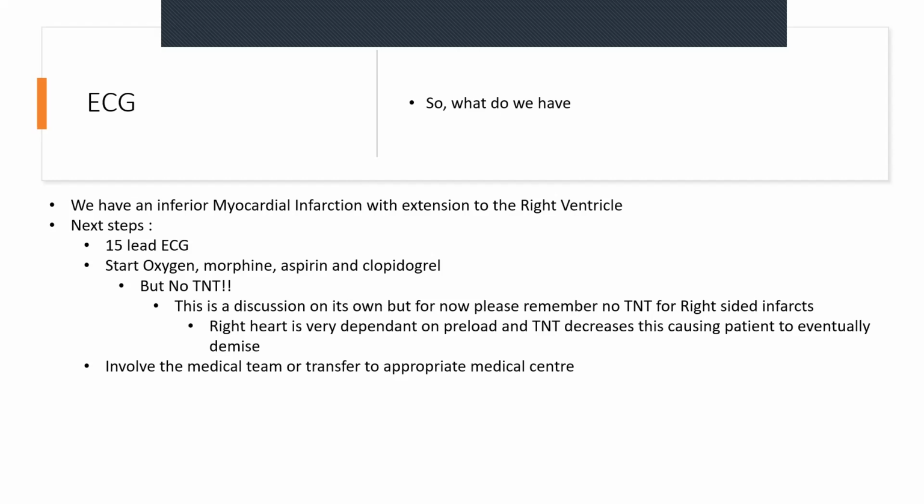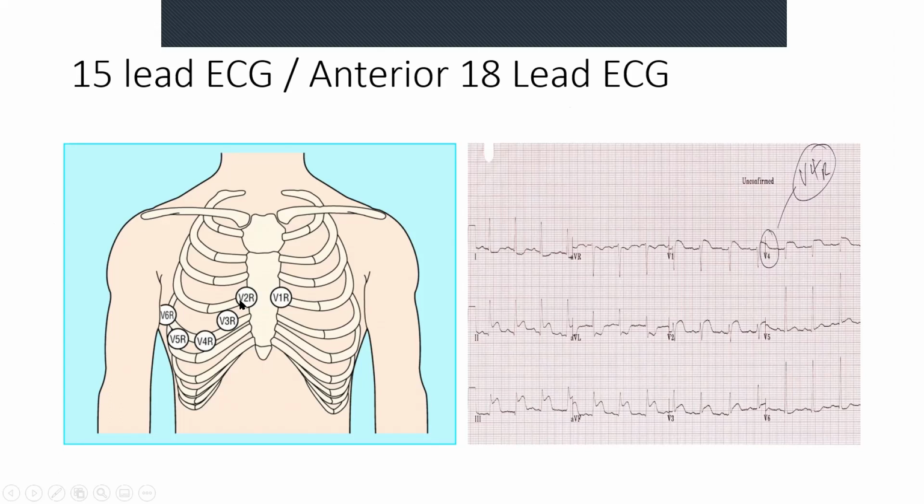So they tell you to do a 15-lead ECG or an anterior 18-lead ECG, depends on who you speak to. And you put the phone down and you start panicking. You're like, what are these people talking about? So I'm going to show you what it is. It's actually quite simple. It's just a moniker for how we look at the right side of the heart.